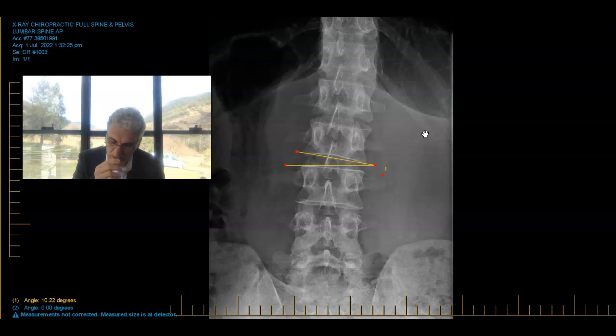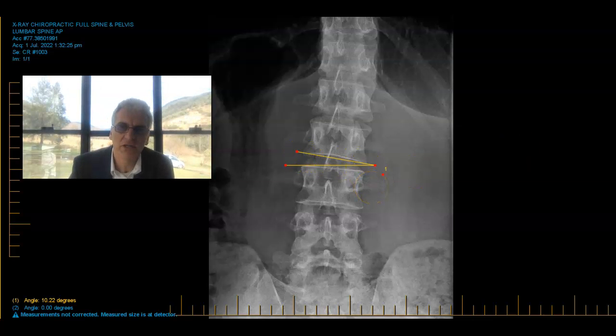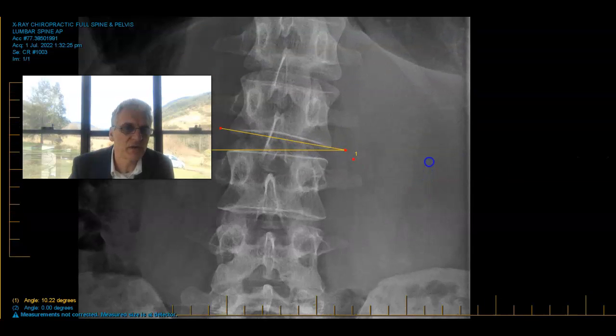a position where we can see a little bit more globally why I've chosen this vertebra here. Now, you'll see probably with the eye that 5, 4, 3, 2, lumbar, 1, lumbar, 12, thoracic in this area in here, and there's the ribs just to confirm that. But you'll see here why I've chosen the second lumbar and the inferior end plate. And that's simply because we again enlarge that, it's the one that's got the most tilt.